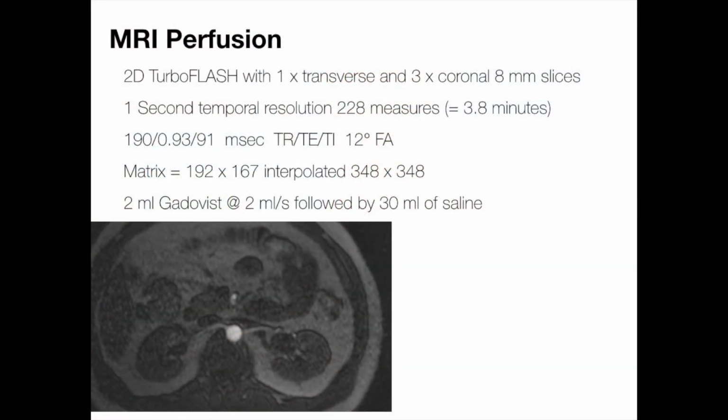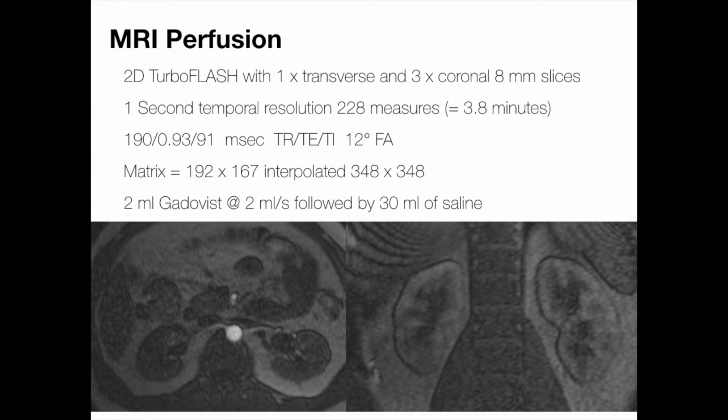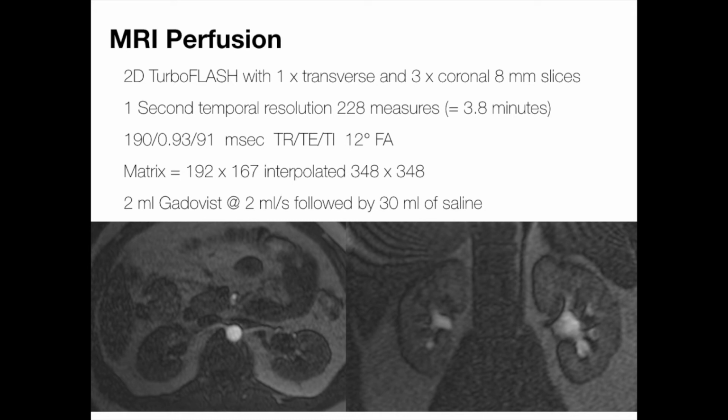So we use renal perfusion now for our renal donor protocol. We take first-pass images, coronal and transverse. We use this basically as our timing scan. But it's not just a timing scan, it's a small dose of GAD, but we run it out multiple times over about 3 minutes, and we can then, Rosario I think is in the audience, can spend some time, and we've shown as a poster at this conference about the fact that we can actually do single kidney GFR and differential functional estimations from these.